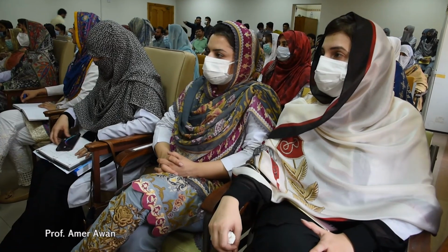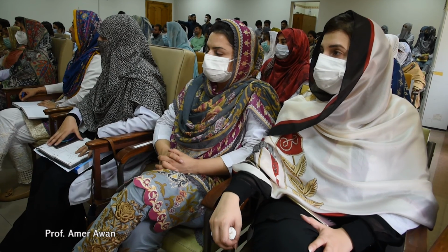So this is another patient, an only-eye diabetic patient, who had this sort of picture. Vision was significantly distorted and came down. What was happening was that because of the traction, he's developing a lamellar hole, and these receptors are getting blocked. We are seeing the outer retinal structures here. That's why the vision is a bit better, but he's having significant distortion. And even in the multiple sections, you can see it here.